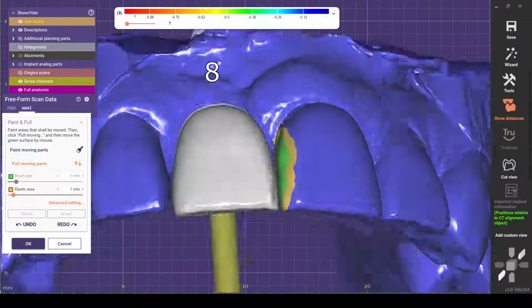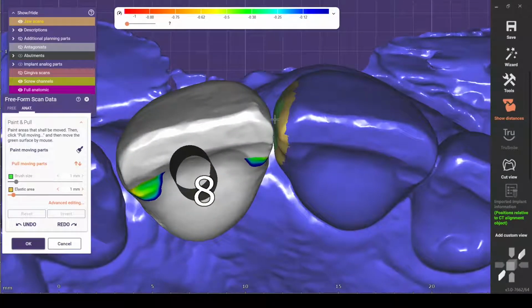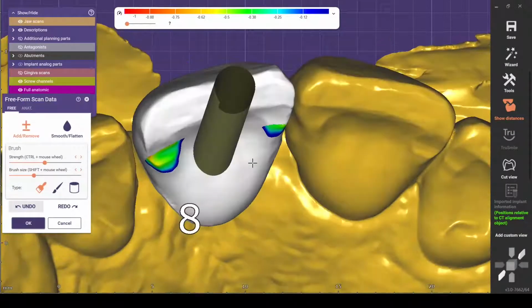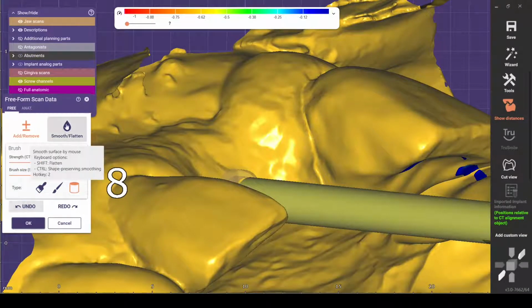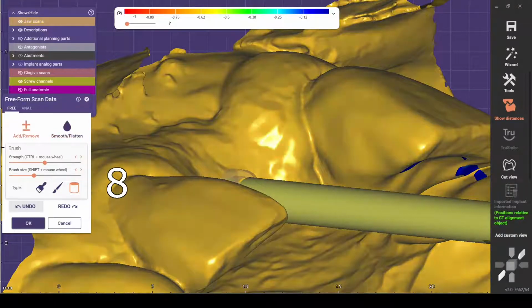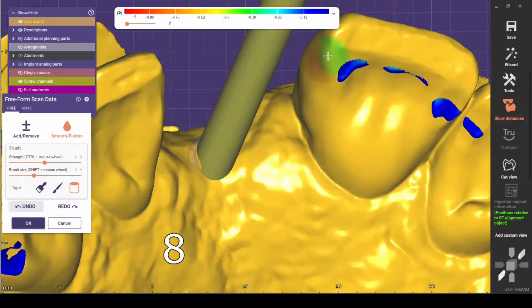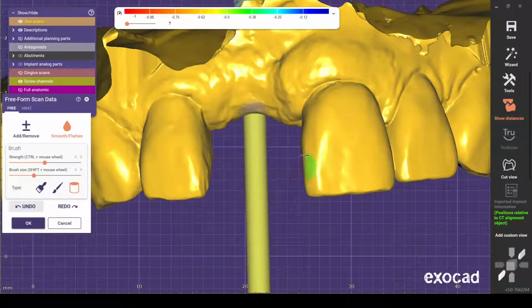We're going to open that up again just a little bit. Okay. Go back to free before we close that and do our smoothing again. Oops, undo, smoothing. So hotkeys 2 and 1 can switch between add or remove and smooth and flatten. I like that better anyway. There wasn't that stretch kind of area.